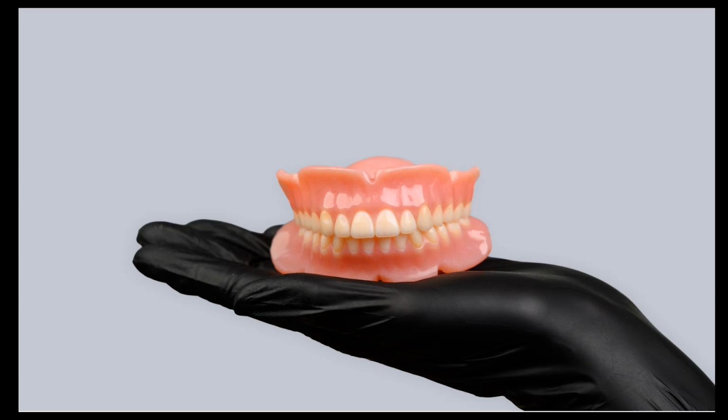And that's it for the dental view, at least. The dental view is basically a display filter. It helps you see which models are compatible and not compatible. And then after analysis, it helps you see which models are defined as the corresponding tooth type. Once you're done with that part, you don't have to stay in the dental view. You can choose to. It's up to you, your preference, but it's not a requirement. Then you can turn it off and go back to working as usual.